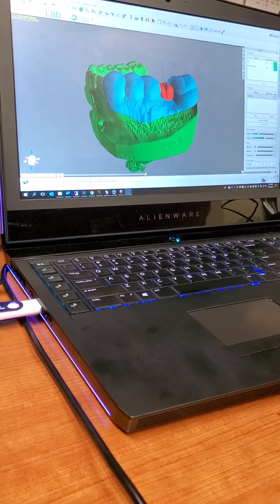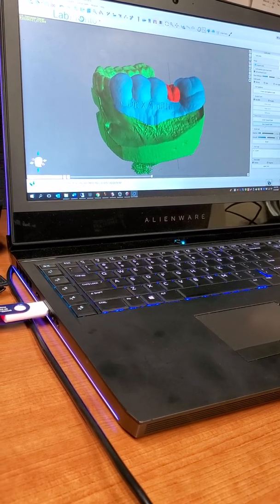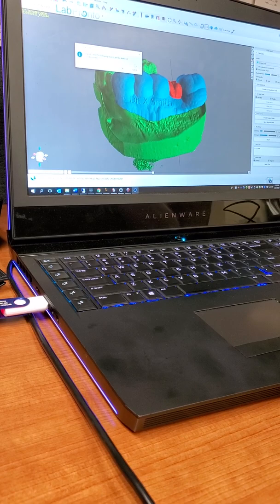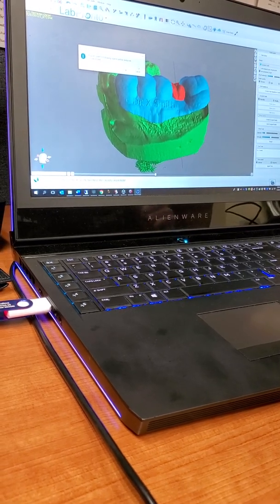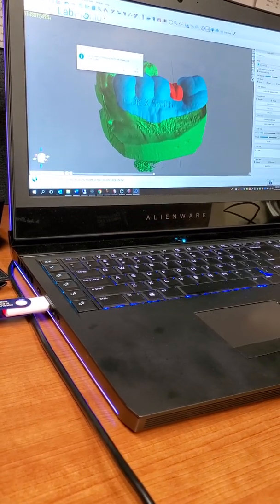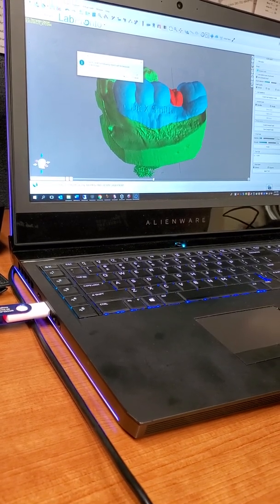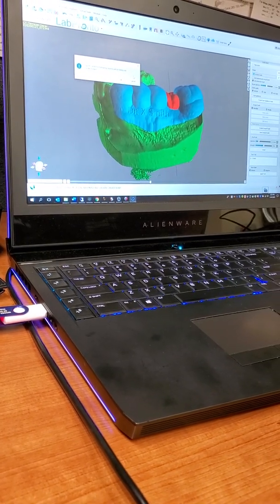So you go back to your guide panel and you click Save Surgical Guide, and it will tell you that you will spend 1 to do that. If you spend that 1, then it will save it as an STL file, and you take the STL file to the printer. That's how you make a surgical guide in Blue Sky Bio.